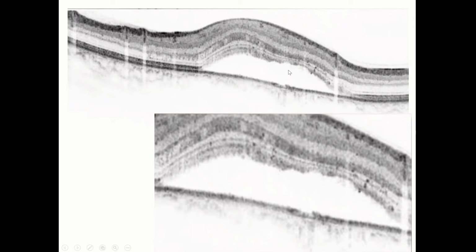The important thing to see in these patients is that you can see all the lines going over here. So this is the retinal pigment epithelium. After that, you've got this ellipsoid zone. It is going forward. It does not remain that black. This is the external limiting membrane, which is intact all the way. So this patient has got a good visual potential for recovery.